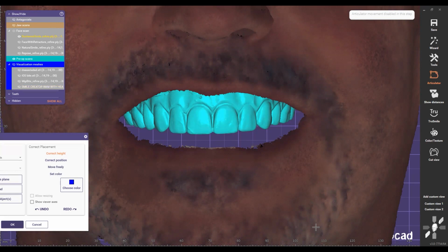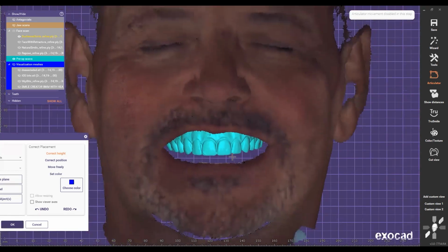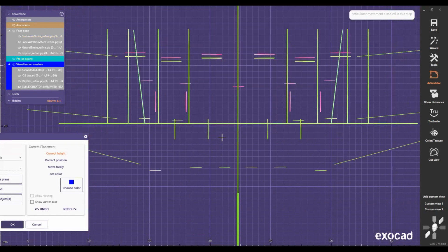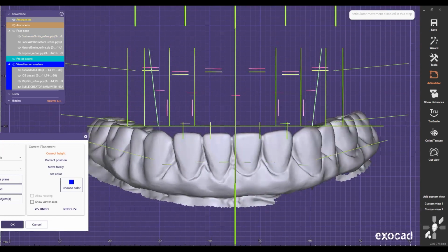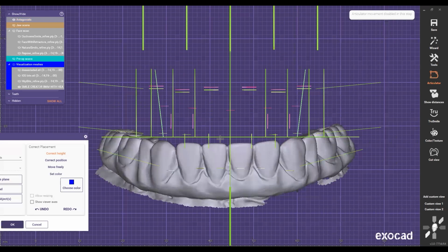Veneers, we have workflows for veneers, overdentures, dentures, crown and bridge, all of these cases. We have protocols for how to do these cases. So that's how confident we feel doing these cases. So now I know where I'm gonna put my incisal edge position. It's gonna be right there. And then probably once I start the design, if I see that the lower is there and I'm gonna compromise my design, I'm just gonna try to make it a little longer.